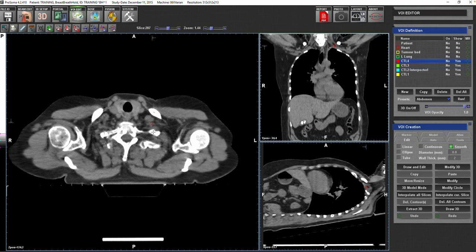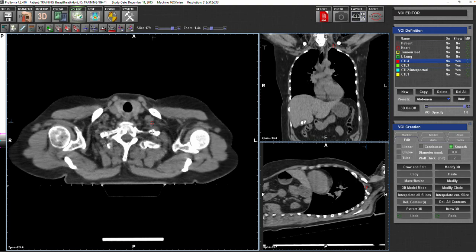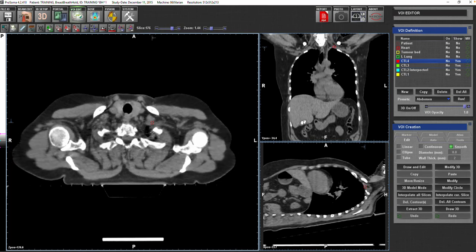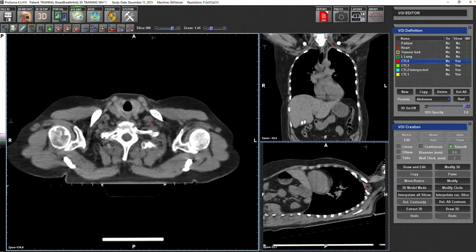We know that with volumetric CT scan imaging, what you can see here is a kind of interpolation as well in the slide. So there is something called the partial volume effect, where you can miss the structure if you don't take a margin around it properly.